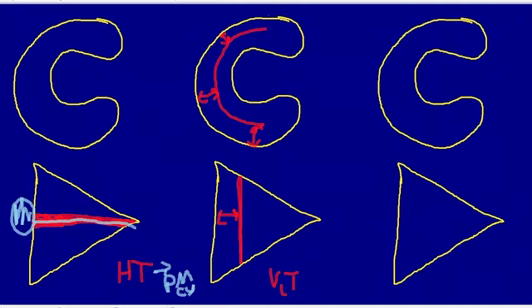The complication of a vertical tear is that if it comes close to completing itself, and it doesn't necessarily have to complete itself, then with the right amount of force in this direction, you could wind up with displacement of this fragment. Either this fragment will invert and flip inwards into the joint, or it'll get distracted and pulled into the joint. But no matter what, it's going to wind up looking something like this diagram that I'm about to draw.